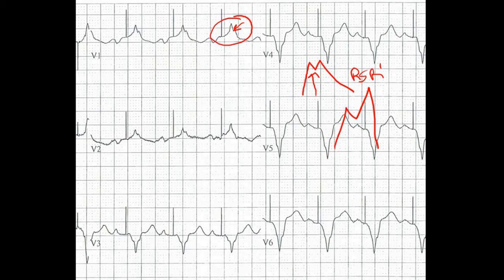And what I'm doing is taking advantage of the fact that everything vertically that lines up is happening at the same time on a 12 lead. So this pacer spike is firing. It's the same pacer spike, and everything I see on this tracing is happening at exactly the same time in this area as it is in this area.